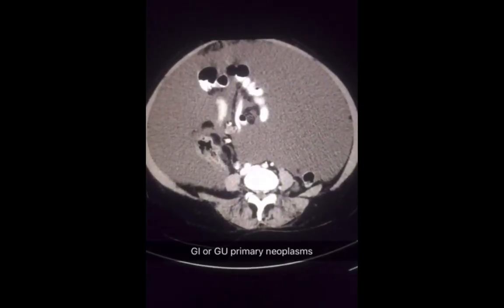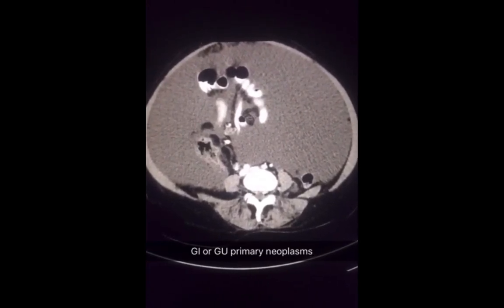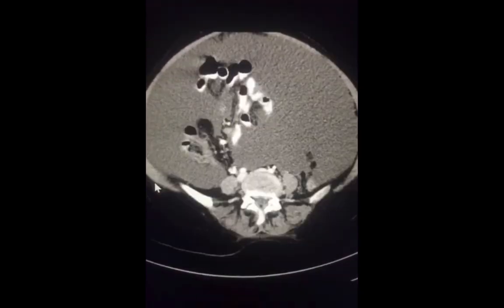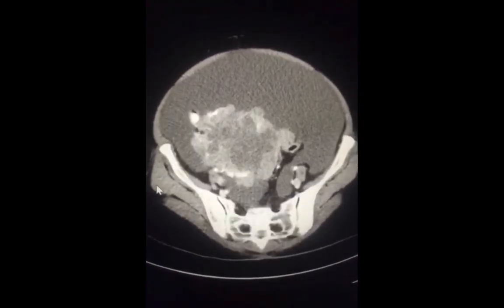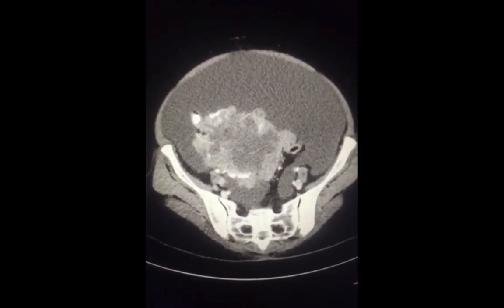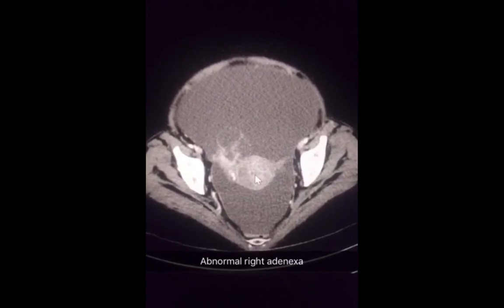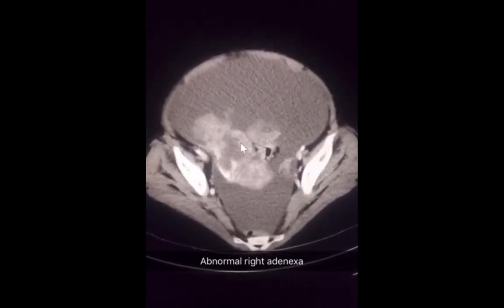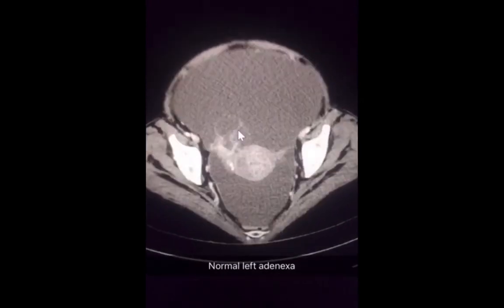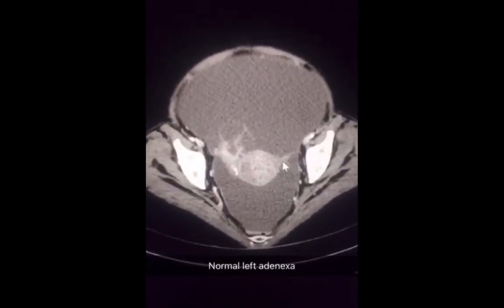Peritoneal and omental metastasis is commonly due to gastrointestinal or genitourinary tumors. If we scroll all the way down, in this case, you'll find a large pelviabdominal mass. This is your normal uterus, and this mass is adjacent to the uterus in what we call the right adnexa. This is compared to a left adnexa that has a normal ovary.